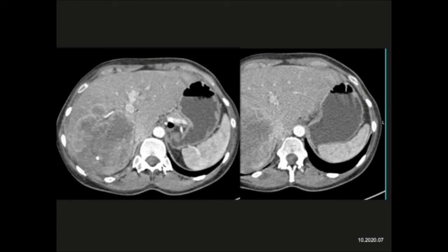Cholangiocarcinoma is definitely a possibility. Can be mass-like. Sometimes it dilates the ducts. Hepatoma is possible, usually more common in a cirrhotic liver, but I couldn't exclude it. FNH, this is not the appearance of FNH. Focal nodular hyperplasia enhances homogeneously, looks like the IVC, does not have a pseudocapsule and becomes isodense over time.